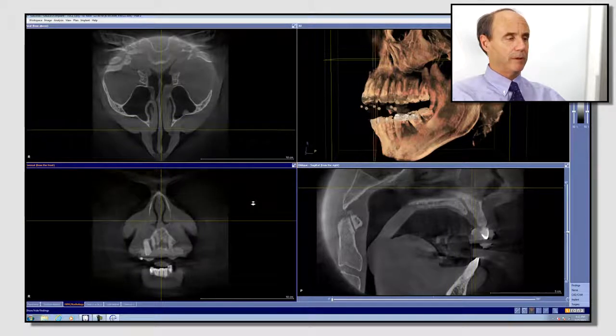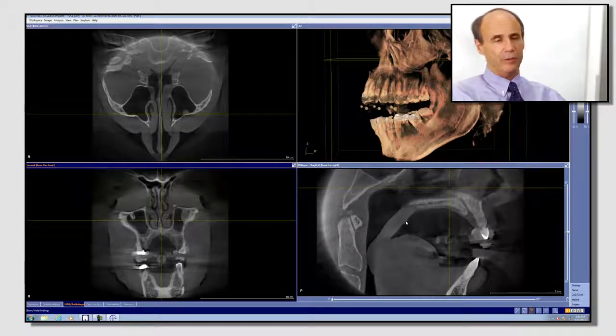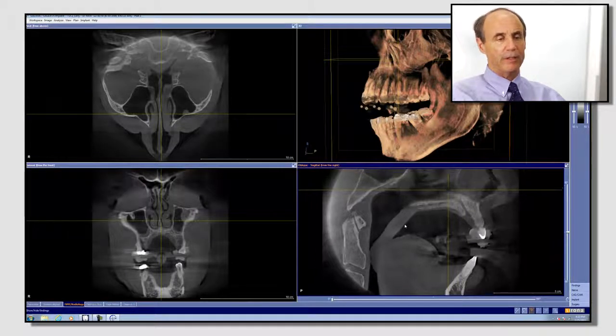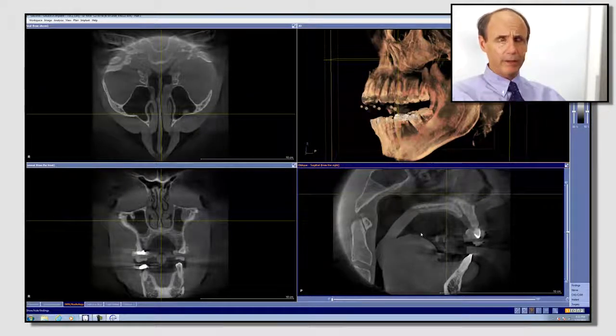If I see something, again, unusual, I will then refer to the sagittal anatomy. Since the sagittal anatomy does not have symmetry, a right and a left side, then I don't go through that unless I see something unusual. So that is a proper way to go through the volume of a patient, which should be done for each patient. With training, it would take about 5 to 8 minutes for each patient.